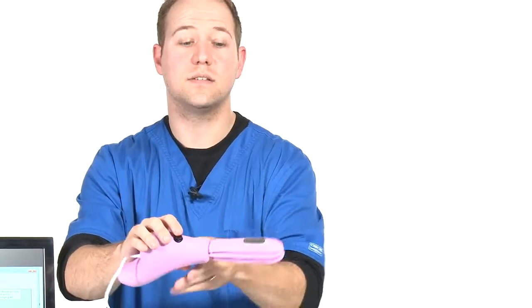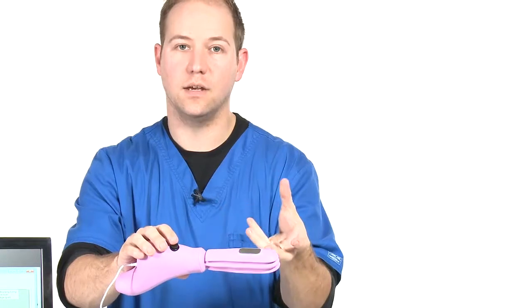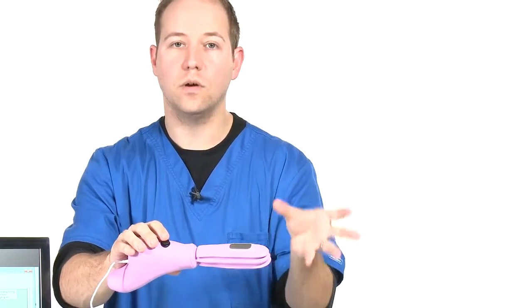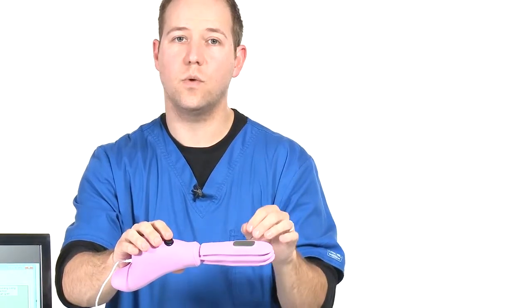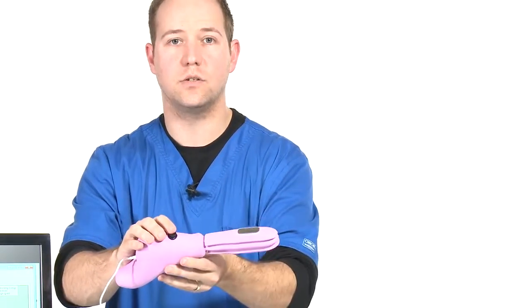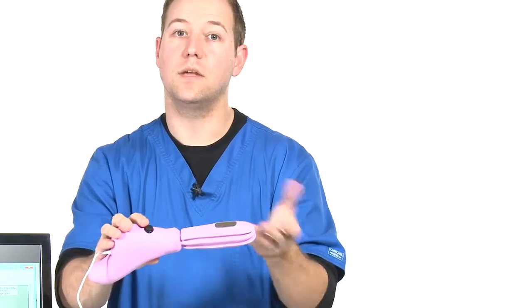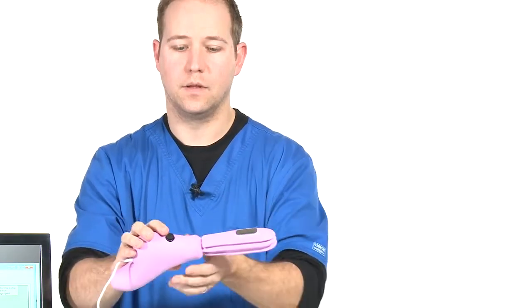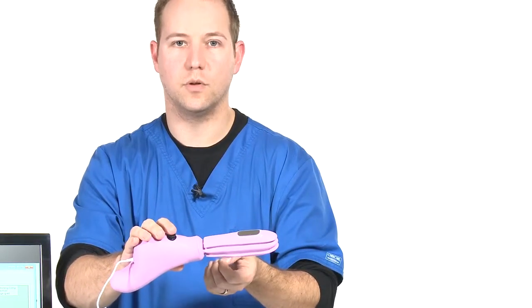They're going to ask, what does the stimulation feel like? You can tell them that it feels like a tingle and then a tug. It will not hurt the patient. You always want to make sure that the patient is aware that when they're actually utilizing their InTone, they never take the device out in mid-use. If they do, it'll feel very uncomfortable because the stimulation will be delivered in a very uncomfortable area.